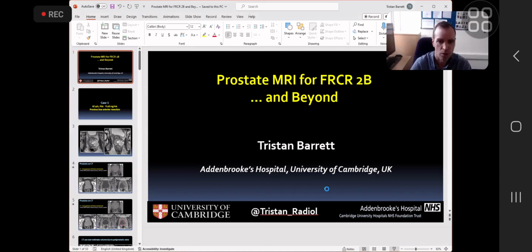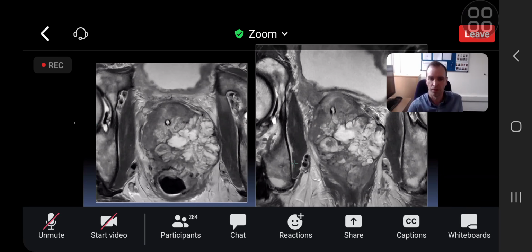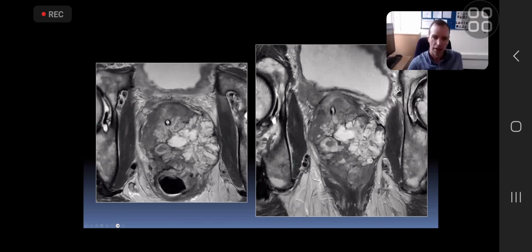So case one, we've reviewed. This is actually the MRI from case one. So obviously we can see a lot more detail on the MRI than we could from the CT. So we can see the catheter in there, and we can see, as we sort of implied, that the center of the mass was over here, and it does look centered on prostate. And it's quite a heterogeneous, unusual lesion. There is involvement of the rectal wall. It's quite cystic in places. This turned out to be favored to be a prostate primary. Tissue was acquired actually from sigmoidoscopy, and quite a complex tumor.